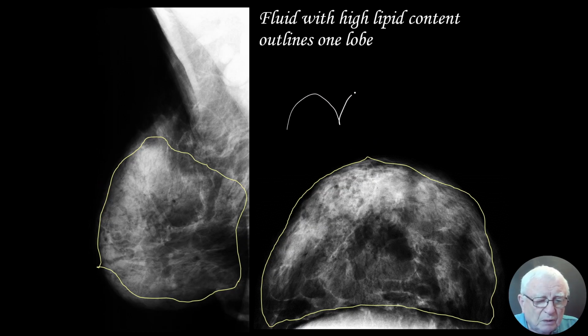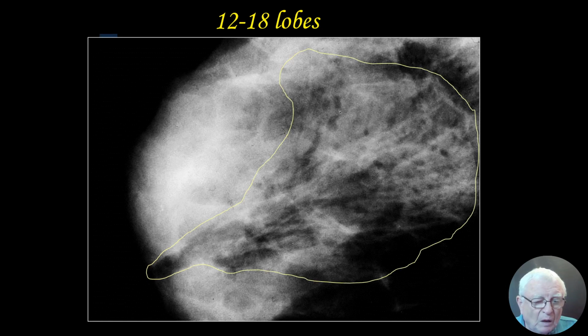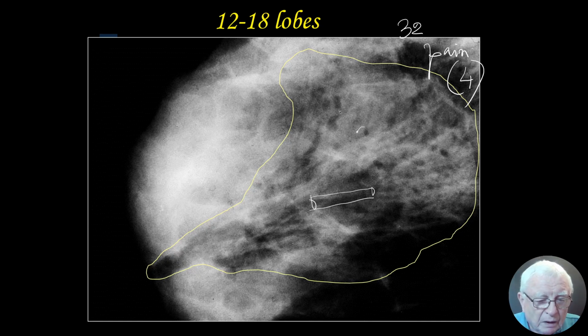And we had this patient coming back again for 2 decades, and the mammogram looks exactly the same. But you go home and you're going to see this picture. Let me tell you the story. 32-year-old complains about breast pain. What do you see on the mammogram? How many of the 4 basic building blocks can you see? This is a duct outlined by radiolucent material. This is a TDLU outlined by radiolucent material. And this is fibrosis. And this is fat.